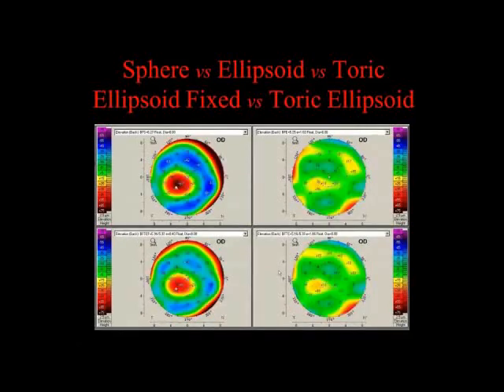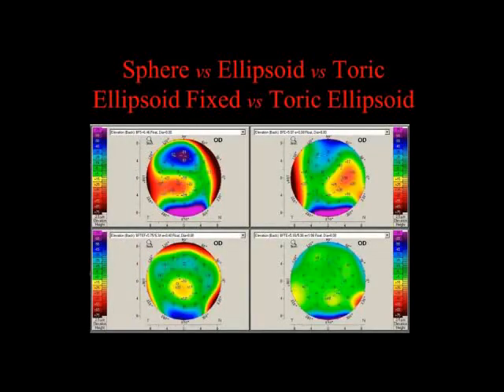Kind of another example, prominent over here. Here, but clearly masked. You can see it here, but again, lower magnitude. You can see it here, but again, lower magnitude. Another example, here's an astigmatic pattern with the positive island superimposed. Less clear what's going on here. You can see it here, completely masked here.